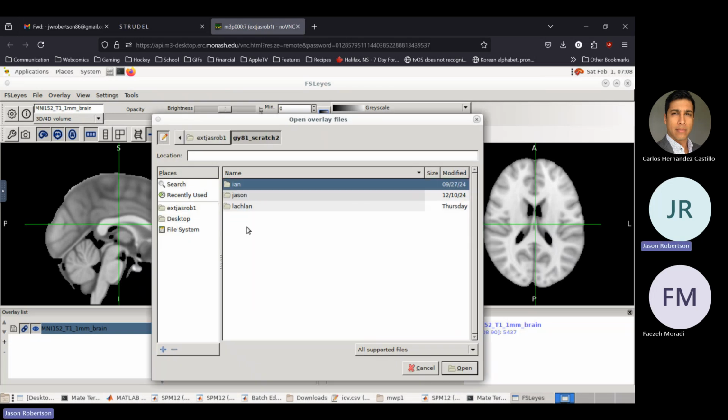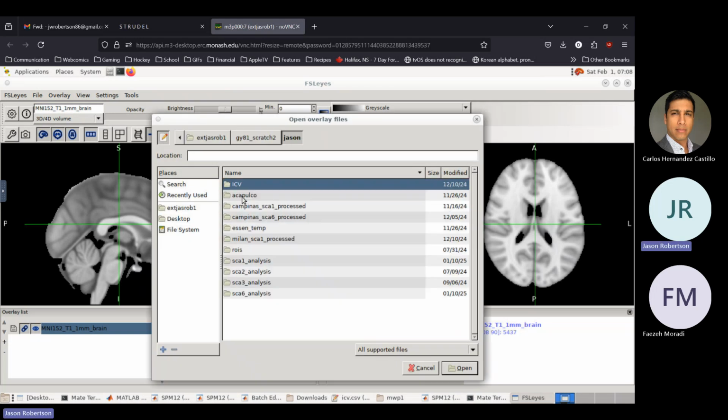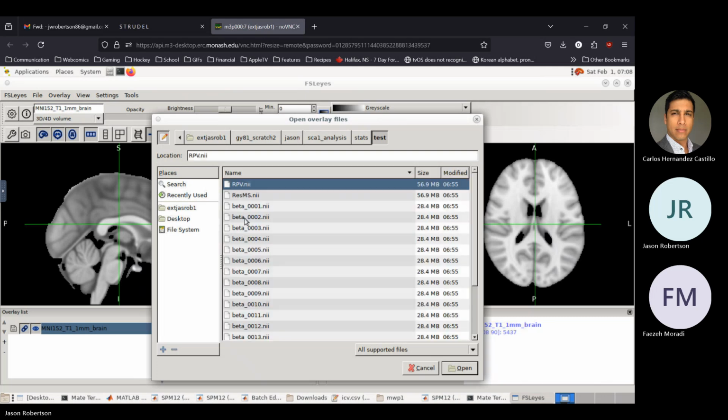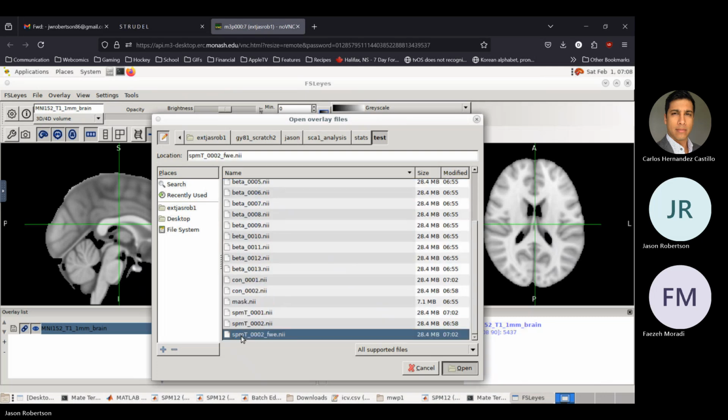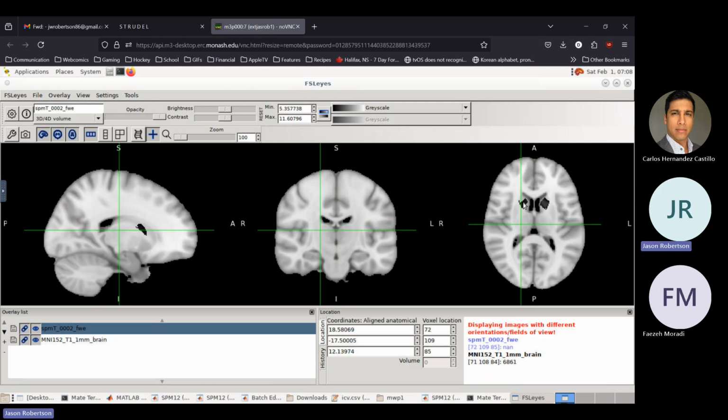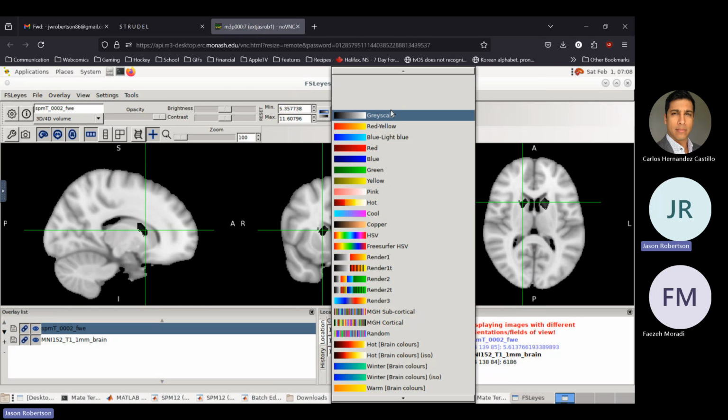I'm going to add as an overlay, so you can see here, and I'm going to put this in a different color.